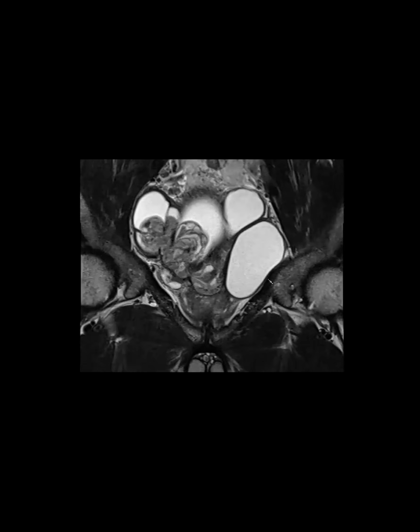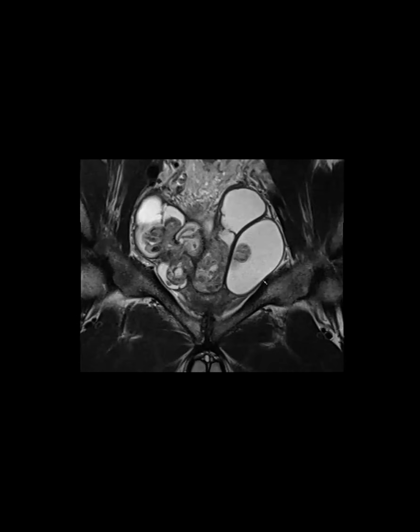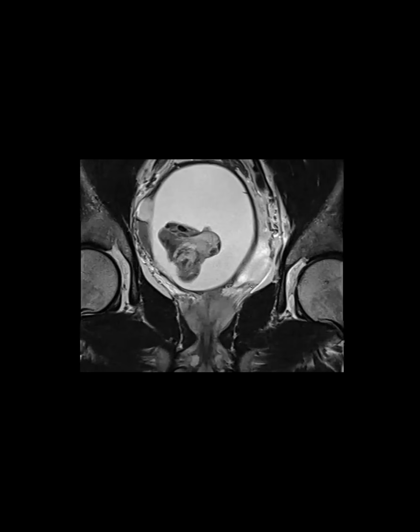Okay, any last thoughts? We've actually shown some cases here. I think, is this some weird stump involving the seminal vesicles? So it's not a stump. Although, you know what? This entity might overlap with stump. I've got to do more research about it.